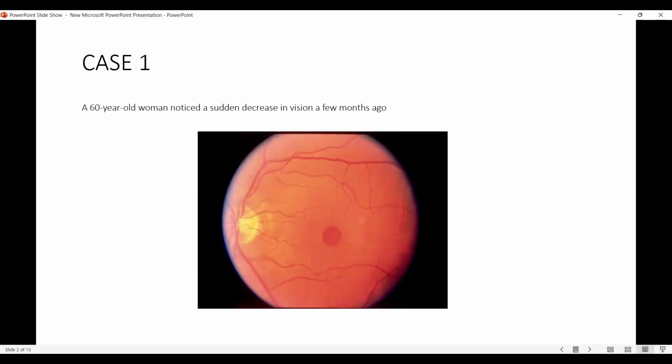The central fovea, where the images are focused, there you will find some abnormality. And if you do optical coherence tomography, you will find some changes in the ellipsoid zone or the RPE. Okay, sir. Because of the large image, you have to tailor your differential according to the image. You can say that this can be a hemorrhage, that is okay, or macular hole, but solar retinopathy will not come as a differential in such a large type of lesion. Yes, sir, large lesion. Okay, sir.